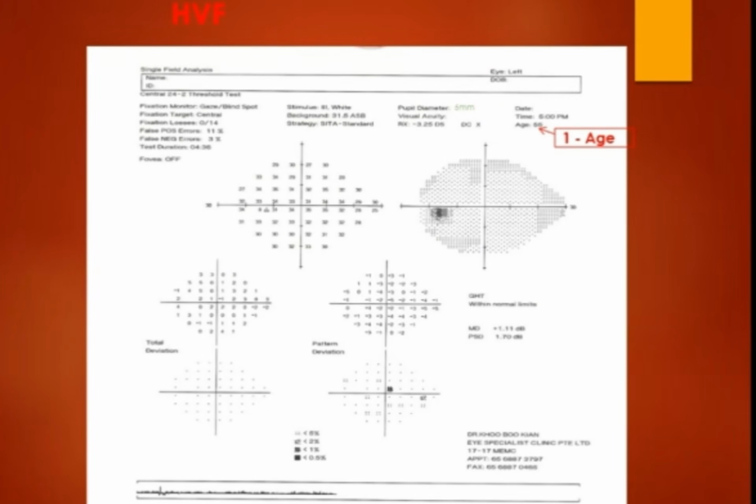If you get the visual field results, you look at the patient's demographic data, you look at the age, you look at the patient's prescription, for some patients who wear high-powered lenses, sometimes you may need to give them their lens equivalent for them to be able to appreciate the visual field testing. You look at the pupil size. You now go over to the reliability indices, which we'll call the catch trials as well.